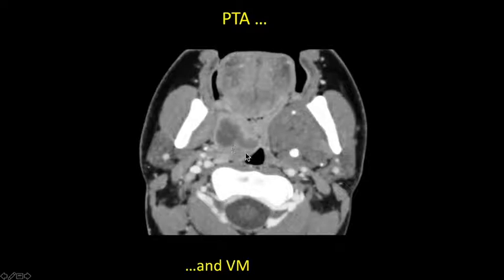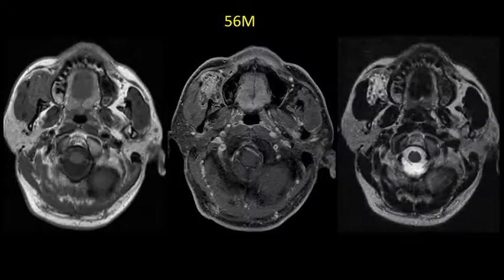And why am I showing you two of the same thing? Well, because this patient had another thing on the unaffected side, at least not acutely affected. They have this soft tissue mass with what looked like phleboliths in it. And so it turned out they also had an incidental venous malformation on the other side. And venous malformations are commonly found in the masticator or buccal space. They can involve either space or both, as I was saying.